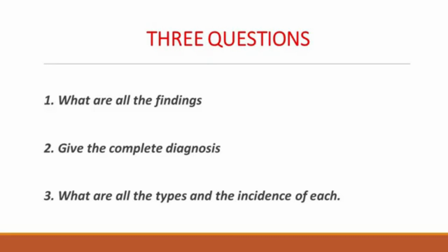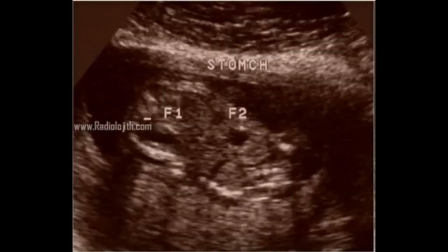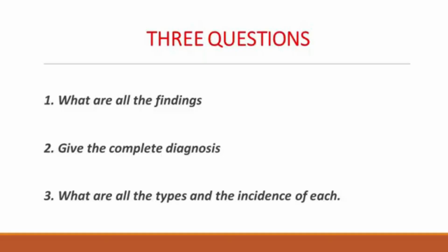The sonographic images are at least 15 years old. They do not look majestic, but the images are still very diagnostic. If you want more time for the diagnosis, pause the video and go back to assess the images. Within a few seconds, I'll give you the findings and the complete diagnosis and then go for the discussion. Are you ready? Let's go.